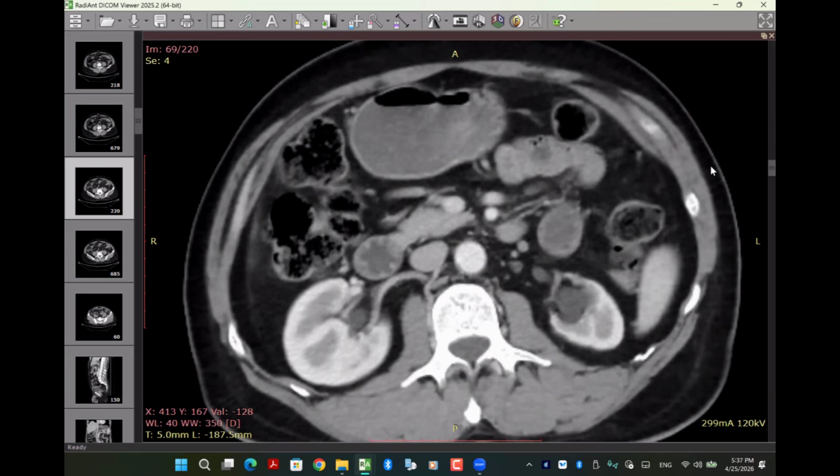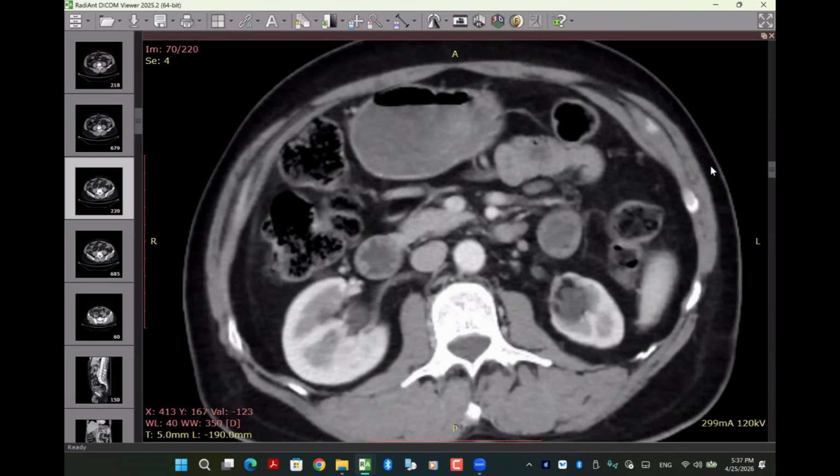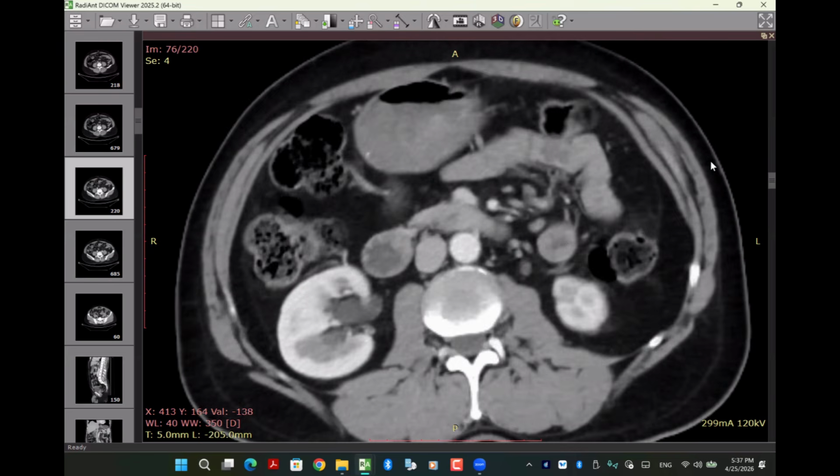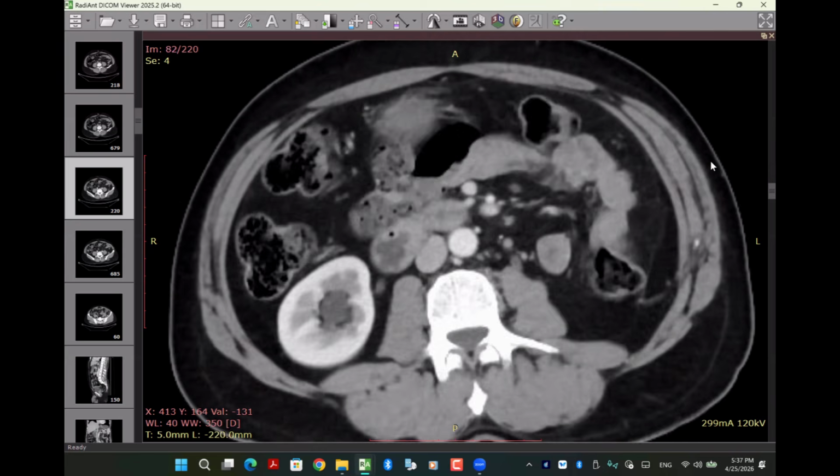If the patient has a history of hematuria and weight loss, this should be further evaluated. No frank mass is seen in the kidneys. Okay, continue. So what else in this scan?